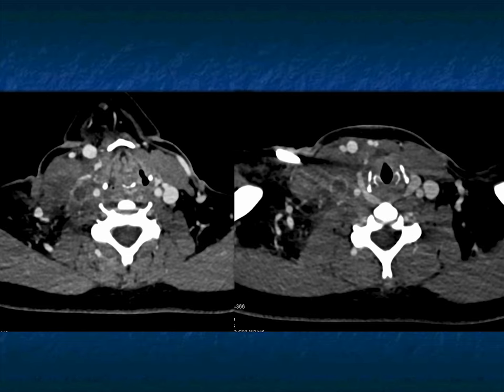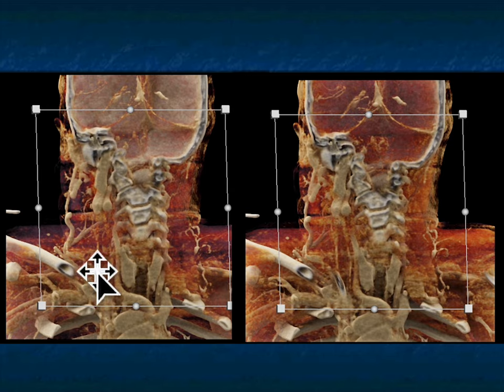You see the inflammation. When I look at the cinematic rendering, look how nicely the jugular vein thrombosis is seen. You can see the length of it. You can see the catheter tracking down. And it really is that the catheter caused the jugular vein thrombosis. People typically say that the longer the catheter is in, the more likely you can get JVT, but you could have it only in for hours and still get the complication, though that's less common.